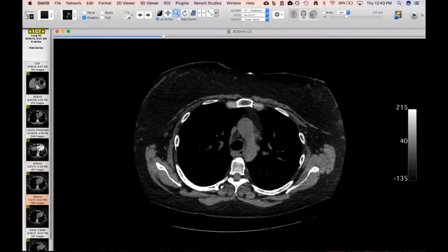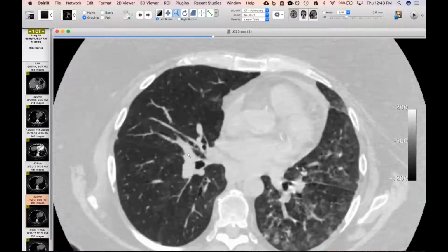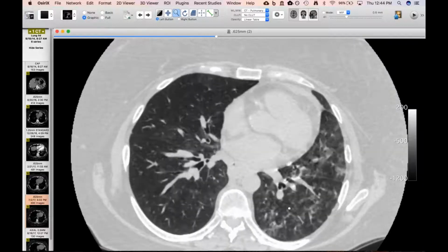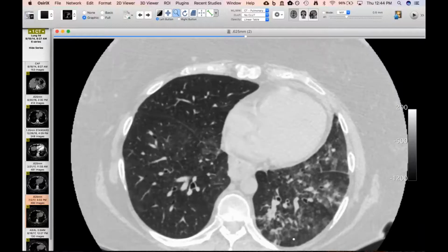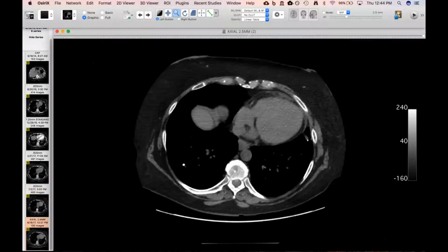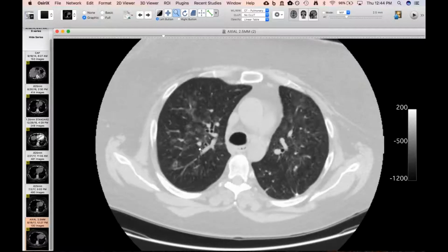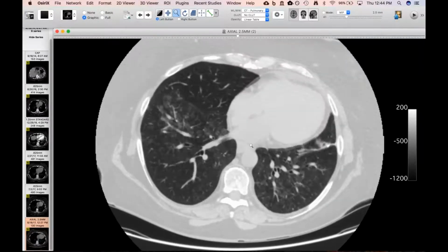And then I think it was this study where you see she's symptomatic again, and it's much more asymmetric on the left side, but still more of a centrilobular process with faint centrilobular nodules. Some areas are more discrete, little lobular areas of consolidation. As they're talking, there's no history of exposures or anything. So I thought the most likely thing, given it was recurrent and slightly asymmetric, was aspiration, especially given that she had this surgery and her esophagus was a little dilated.